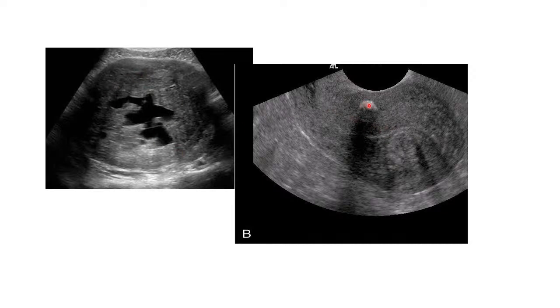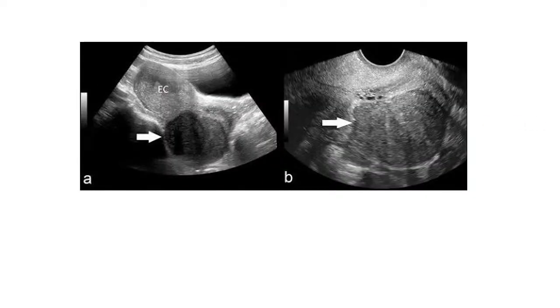Again, you've got a nice calcified fibroid there that I said you must not just ignore, and give a differential of a foreign body depending on the history of the patient. So you can see it there, and then also adenomyosis within this type of uterus. We'll discuss endometriosis in the preceding lectures.